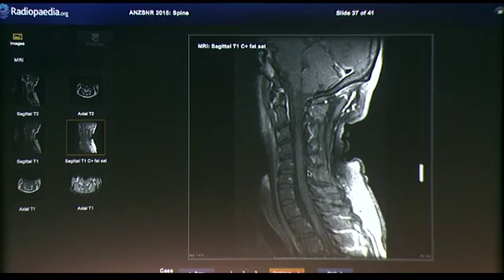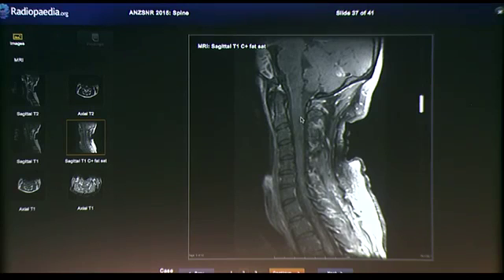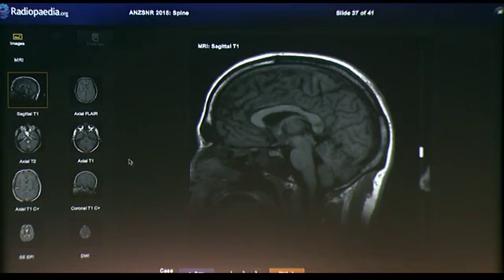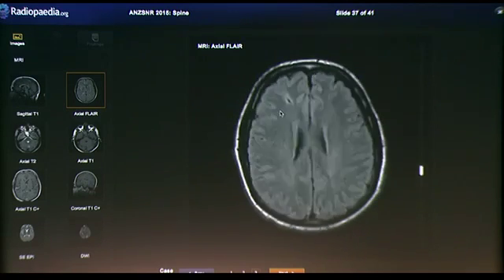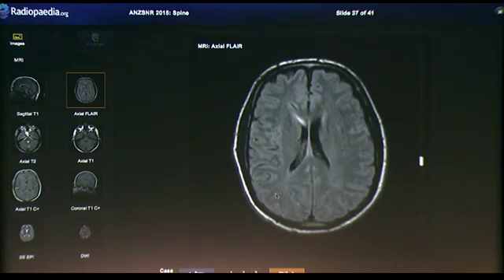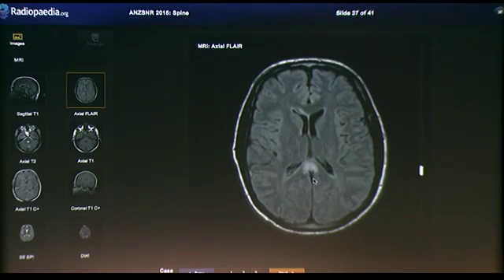we're really looking at the infective causes here. CSF analysis at this time showed increased polymorphs and increased protein. So this was consistent with a bacterial infection. And this patient also underwent brain MRI, which was quite interesting. There was a delay between the spinal MRI and the MRI brain because the patient deteriorated with hydrocephalus, had an EVD put in, as you can see. And we've got this periventricular hyperintensity, as well as hyperintensity in the splenium.